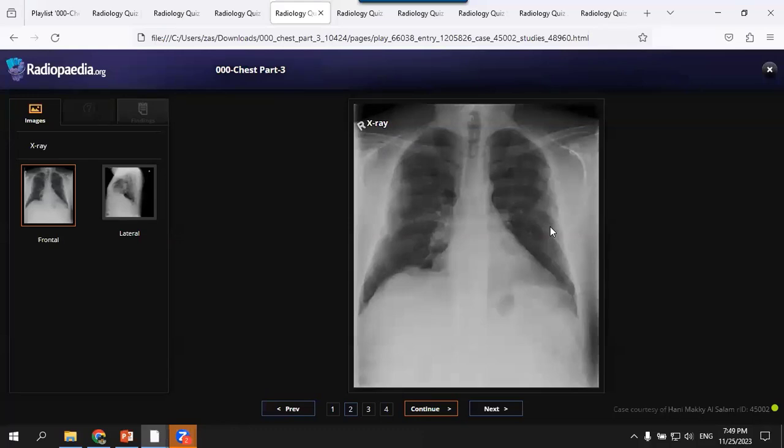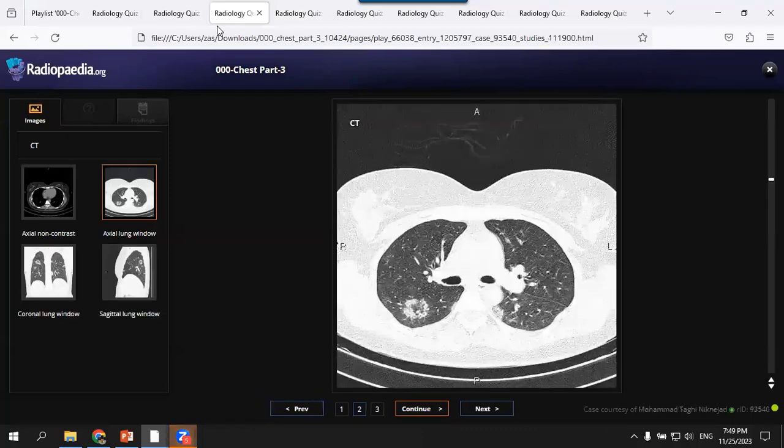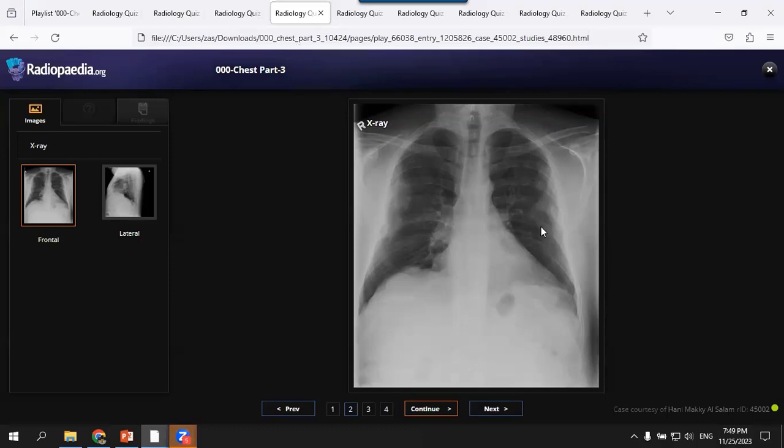COVID-19 pneumonia could be included. And what if I told you there is calcification here? Is it pleural plaques due to previous asbestos exposure? Yes. So patchy opacities, peripherally located, think of COOP or eosinophilic pneumonia.